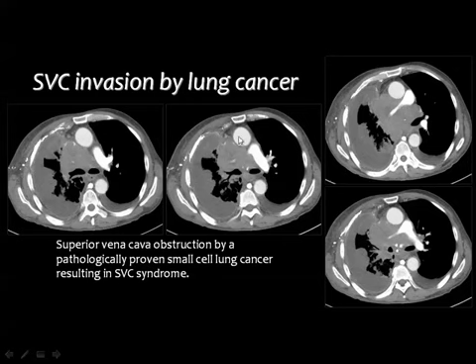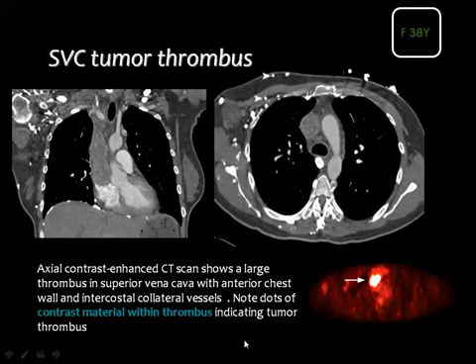And this is a central bronchogenic carcinoma invading the mediastinum, totally infiltrating the vena cava. Here is the region of the vena cava which is really involved by the tumor mass, and also in this case the right pulmonary artery, and the presence of considerable pleural effusion on the right side and effusion on the left side.